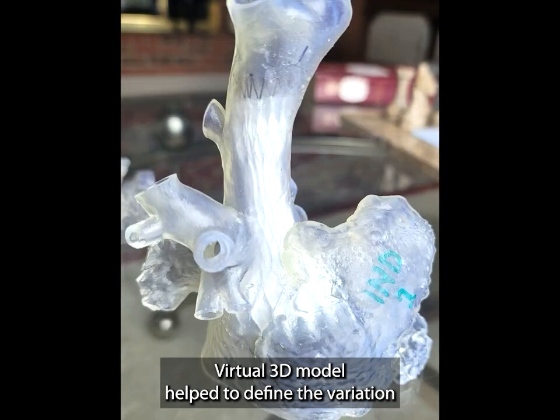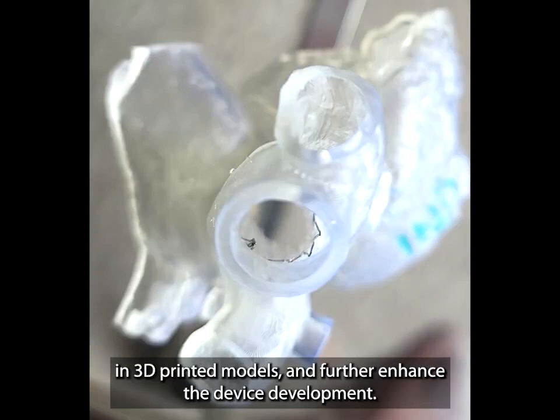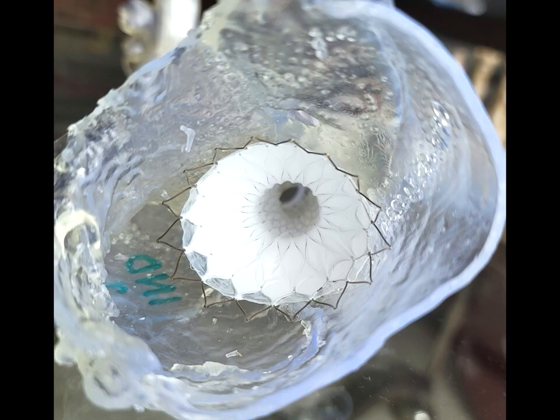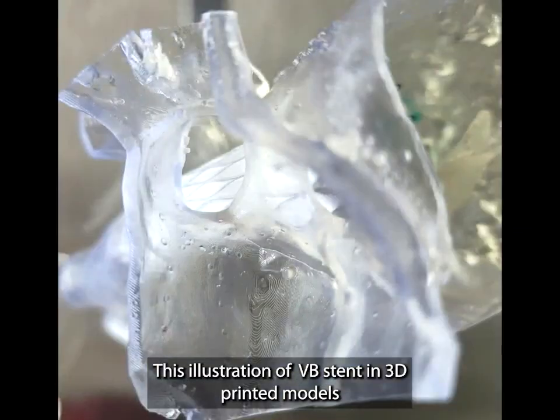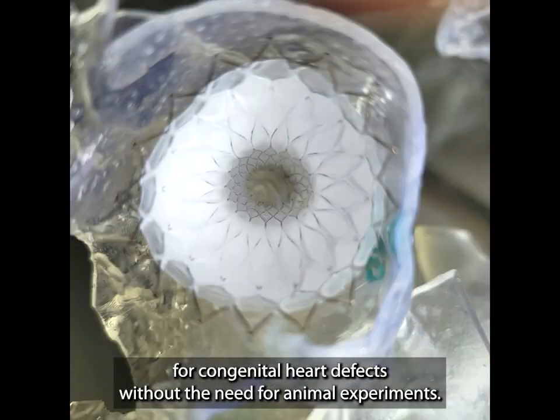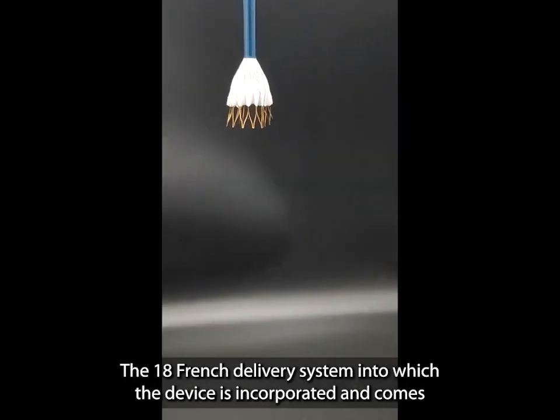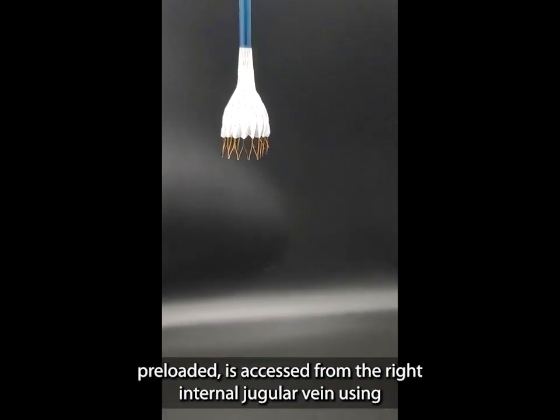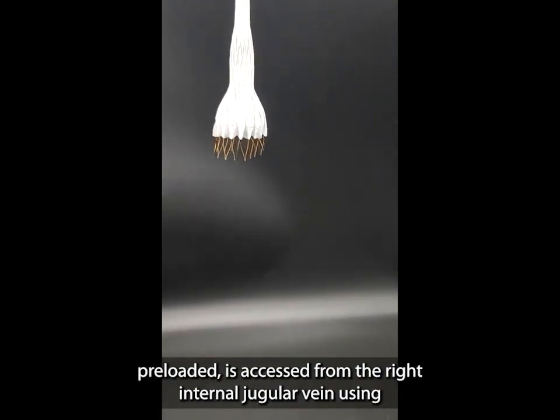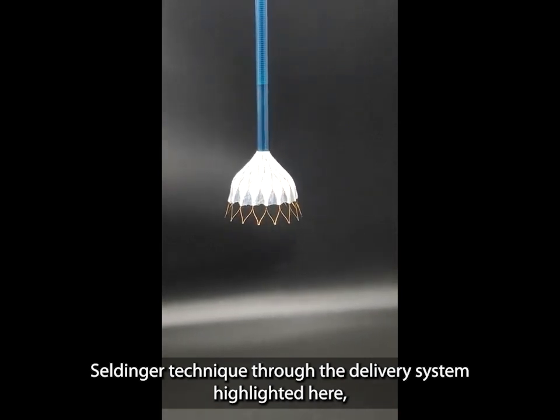Virtual 3D models helped to define the variation in pulmonary venous drainage and implantation of the device in 3D printed models, and further enhance the device development. This illustration of VB stent in 3D printed models highlights the utility of 3D printed models in device development for congenital heart defects, without the need for animal experiments. The 18 French delivery system into which the device is incorporated and comes preloaded is accessed from the right internal jugular vein using Seldinger technique through the delivery system highlighted here.